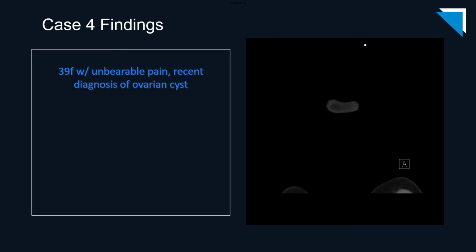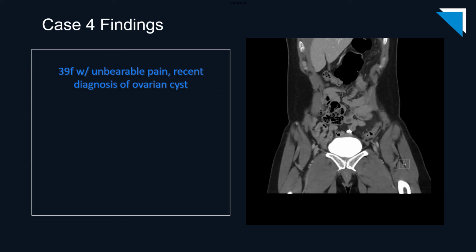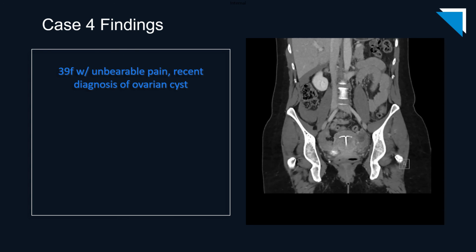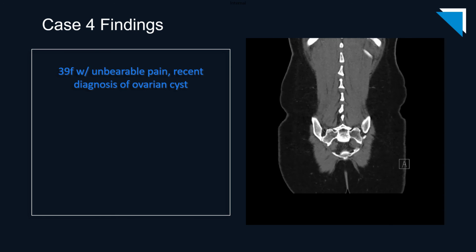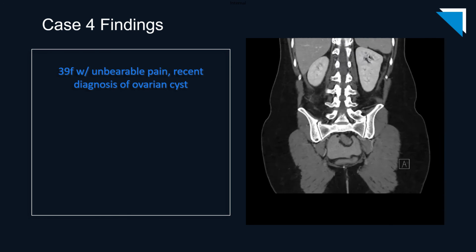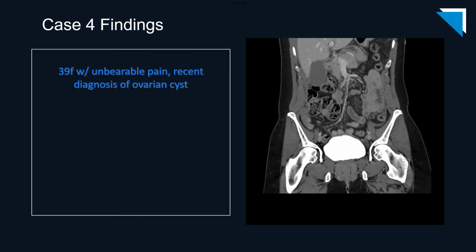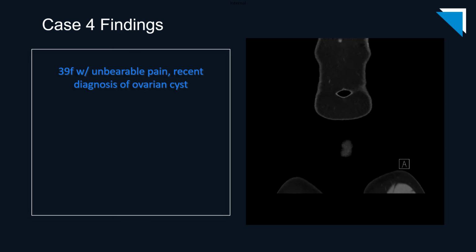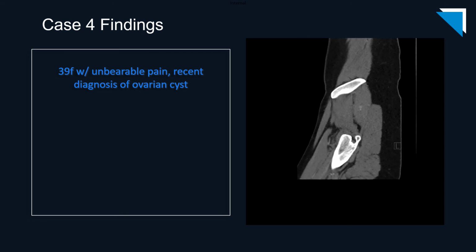Here are the coronal images from that study. And finally, the sagittal images.